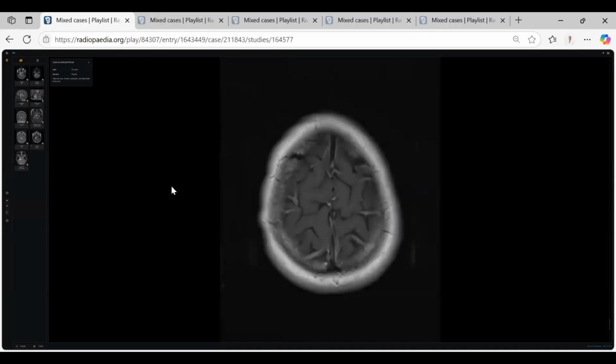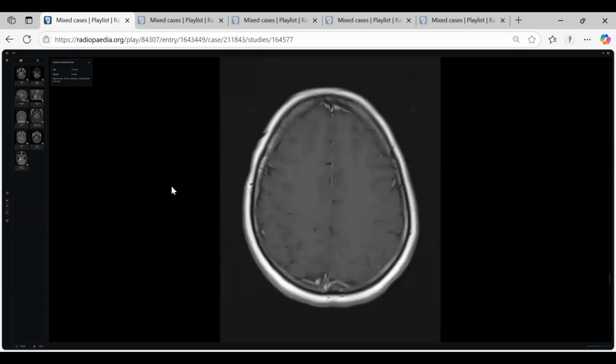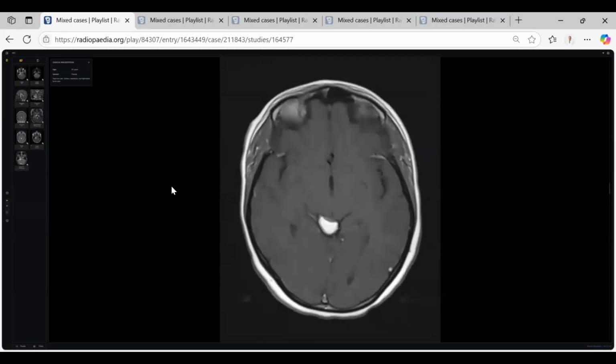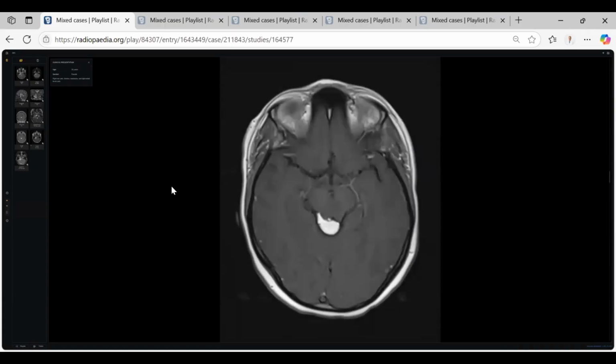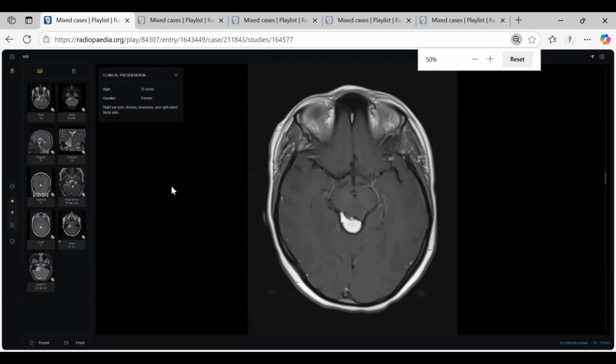I could see T1 hyperintensity along the tectal plate. So this could represent tectal plate glioma or lipoma, sir. How could you confirm, sir? I would like to see a T1 non-contrast image. Are you sure? No, non-contrast image, sir. Are you sure also? This is T1.